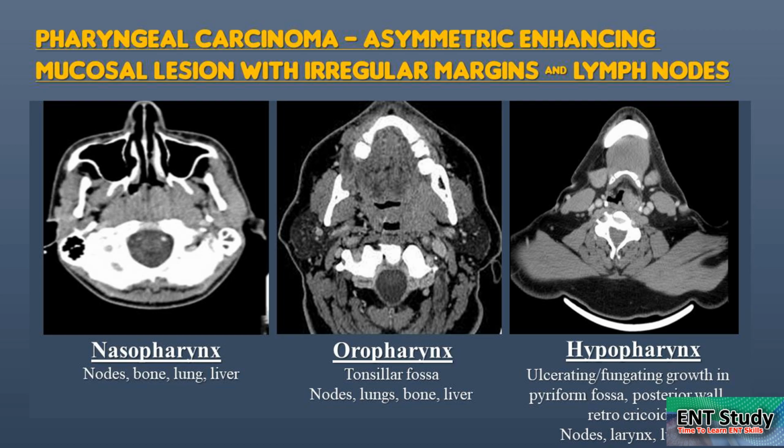There is no soft tissue boundary, there is no fibrous thing which is actually a border closing off these limits. They are all continuous boundaries. So what I basically want to impress upon is that the pharyngobasilar fascia, which starts from the base of the skull and goes down to the hypopharynx, should be a very thin line. It should not be this thicker thing.